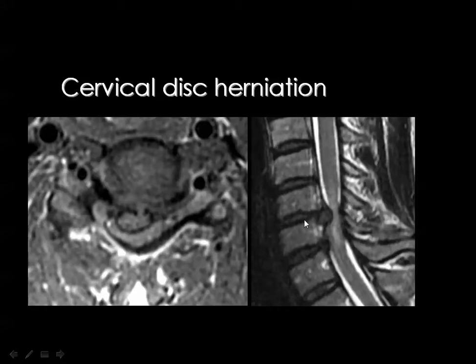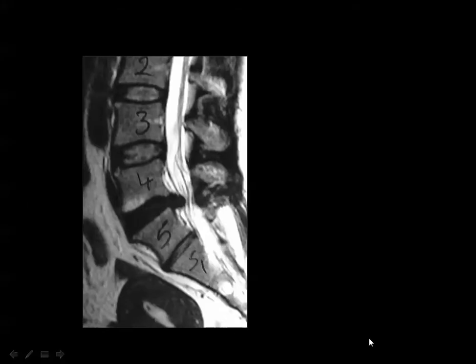If you look here in this cervical spine, and you see there is a disc which is extending inside the spinal canal. The disc is exceeding the vertebral end plate of the vertebra below. Then by definition, this disc should be herniation. And if you go here and you see that this disc is focal and it is more to the right side, and it has a very narrow base and a height which is more than the base, denoting that this is the actual disc herniation.